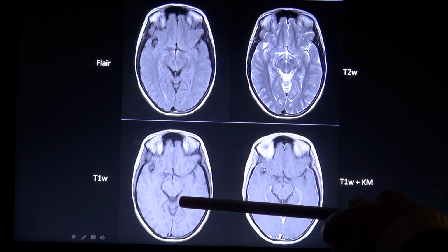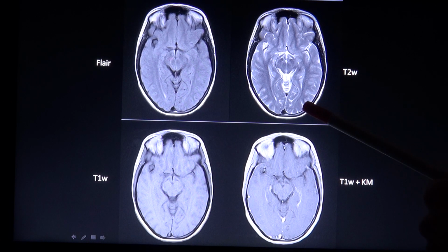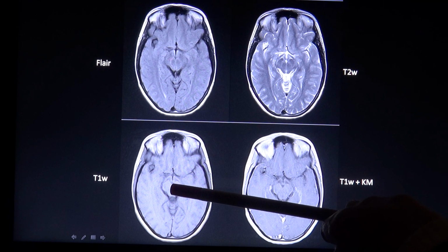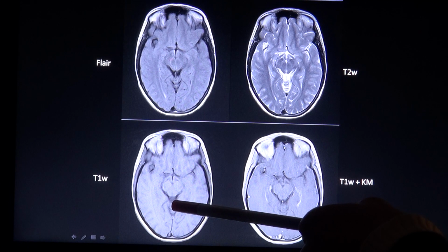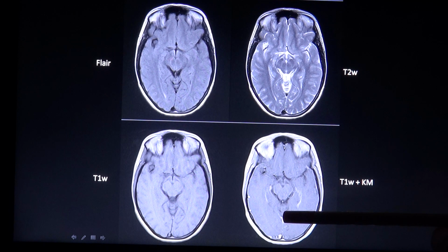Here you see a T1 weighted image. The most important feature that characterizes a T1 image compared to a T2 image is that water appears dark or hypointense, as you say with MRI imaging. So here on this image, the cerebrospinal fluid is dark because it consists mostly of water. Also, an edema or most cerebral lesions appear dark on T1.